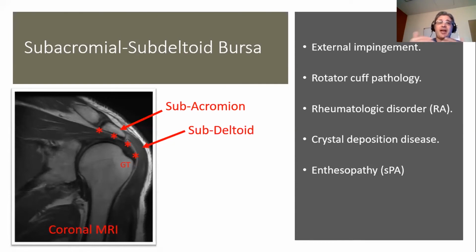The rotator cuff and the adjacent subacromial bursa get impinged between the osseous structures of the coracoacromial arch and the humeral head, causing bursitis due to chronic repetitive friction-related injury.